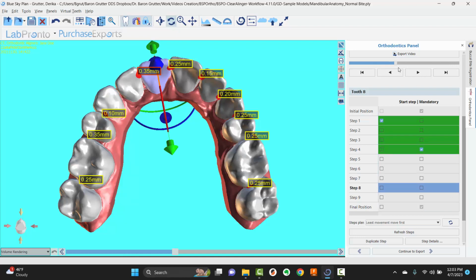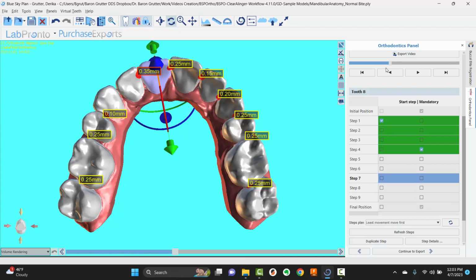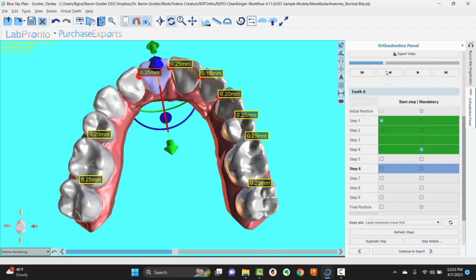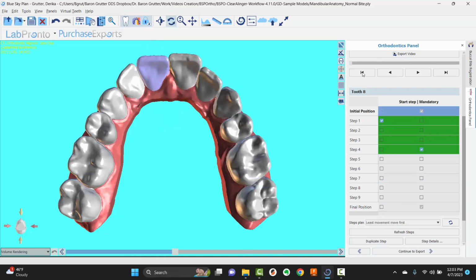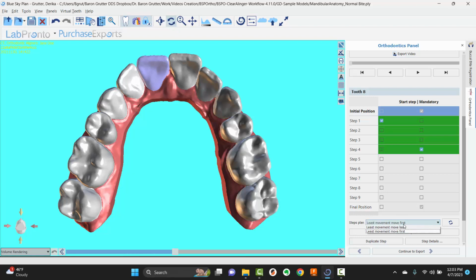Meanwhile, I've got a space on the other side. You might not actually need to. With that diastema, the tooth might just push back there and flex the plastic a little bit. I'll tolerate that up to a maximum of about 0.1 millimeters, but that's up to you. I'll give it a little bit of slack, but in this case, let's just go ahead and see the other way around.